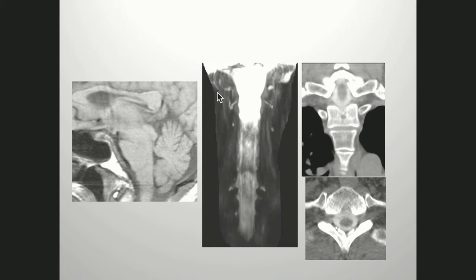Spinal imaging with MR myelogram. Again, this is a heavily T2-weighted sequence. There's no contrast introduction, and we rely on this heavily. It shows no leak in the cervical or upper thoracic region, neither diverticulum or other abnormality. Conventional myelogram and CT fails to demonstrate any abnormality, no cyst or extrathecal collections.